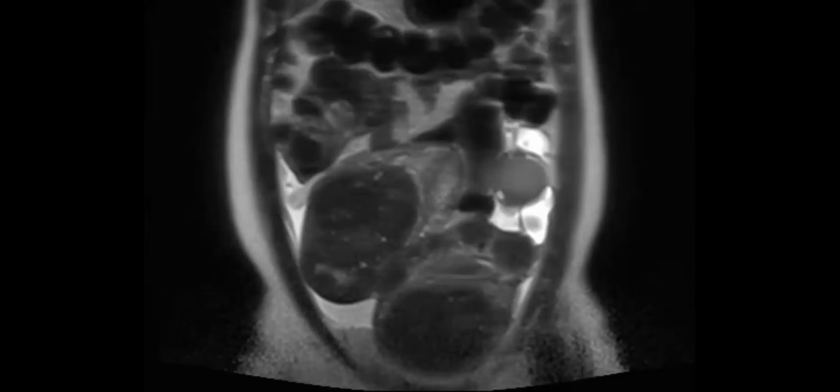Look at this. We see two uterine horns with two endometria and big fibroids in each horn. The fibroids have a funny appearance with T2 cystic foci. It almost looked like adenomyoma. We contemplated that, but they were so dark that we decided they were fibroids. There's a huge cleft between the two horns, so it definitely felt like a bicornuate uterus. That was incidental.